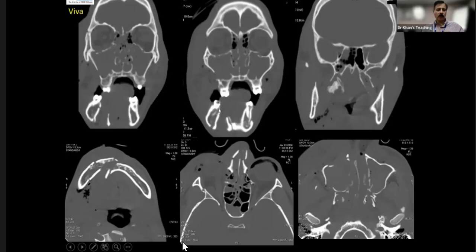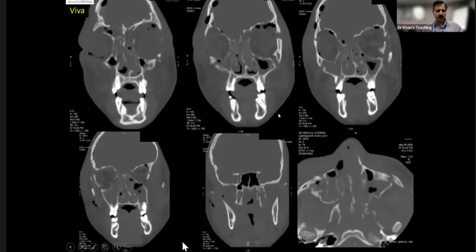And considering if this is present, then it will become a 3 on the right. Yeah. Left. Yeah. This, on the other hand, is bilateral 3. Yeah. If you can see here, the medial wall of the pterygoids is gone, and the lateral wall is gone, pneumocranium, etc.